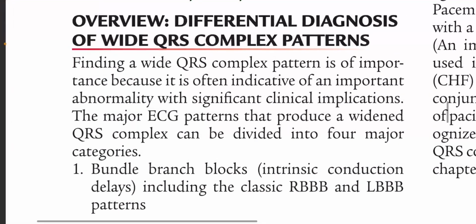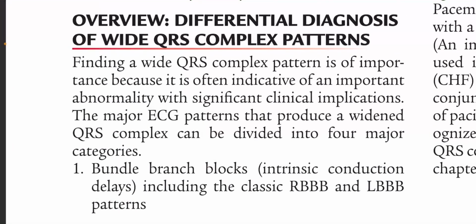of wide QRS complex patterns. Finding a wide QRS complex pattern is of importance because it is often indicative of an important abnormality with significant clinical implications. The major ECG patterns that produce a widened QRS complex can be divided into four major categories.